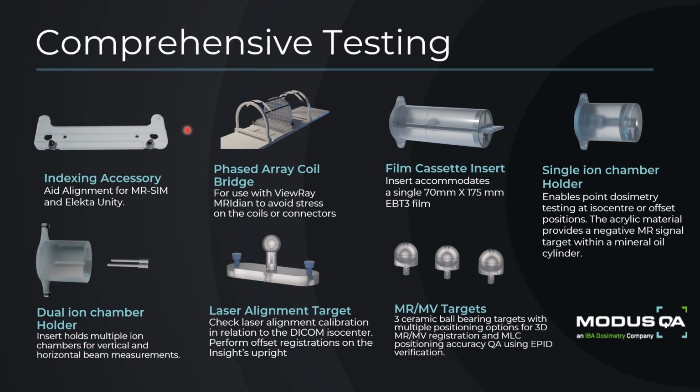Equally, as these MR-MV targets actually house high-density ceramic spheres that show up rather well on both your MR and onboard imagers, they are not only used for 3D MR-MV registration, but they can also be used to assess the MLC positioning accuracy via the Unity's EPID system.